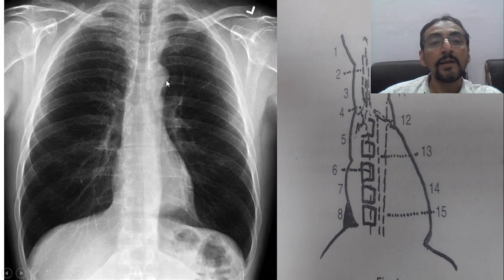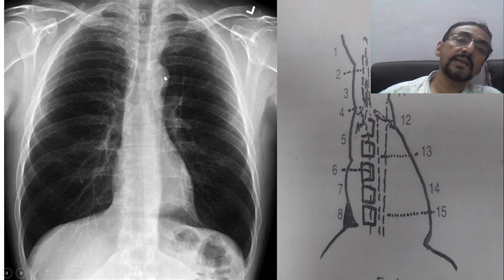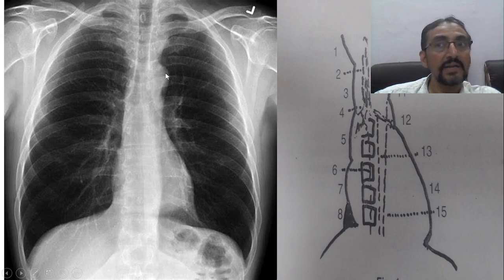Okay. After that, mid pulmonary artery, देखो आप नीचे देखेंगे तो बहुत कम दिखाई पड़ता है, क्योंकि वो आयोटिक नकल के नीचे रहता है, तो उसका विजुअलाइजेशन इतना अच्छा एक्चुअली नहीं होता है. ओके, सो दिस इज द एरिया. नाउ दिस इज द एरिया ऑफ आयोटिक नकल, वेरी क्लियर. ठीक है, यहाँ पे ये एरिया है. एरिया नंबर 10. एंड देन कम्स, यहाँ पे आपको मिलेगा मिड पल्मोनरी आर्टरी.